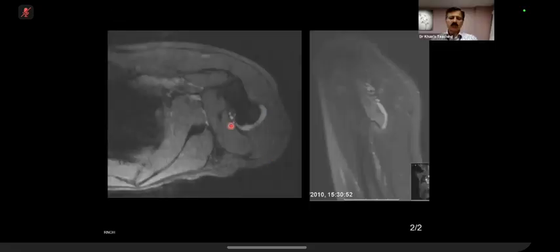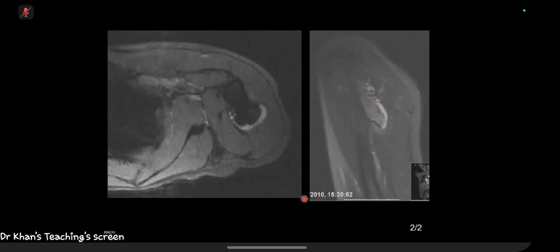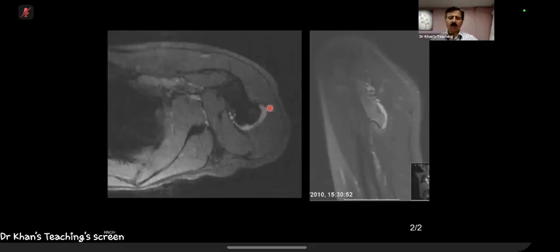Over to you. This is the MR. Of course, you are not on Osirix or a PACS, you cannot measure it, but eyeballing it, what do you think? So it appears to be larger than 2 centimeters. Thickness, not larger. You see the thickness, this is the long axis. From here to here is the thickness, from here to here is the thickness.